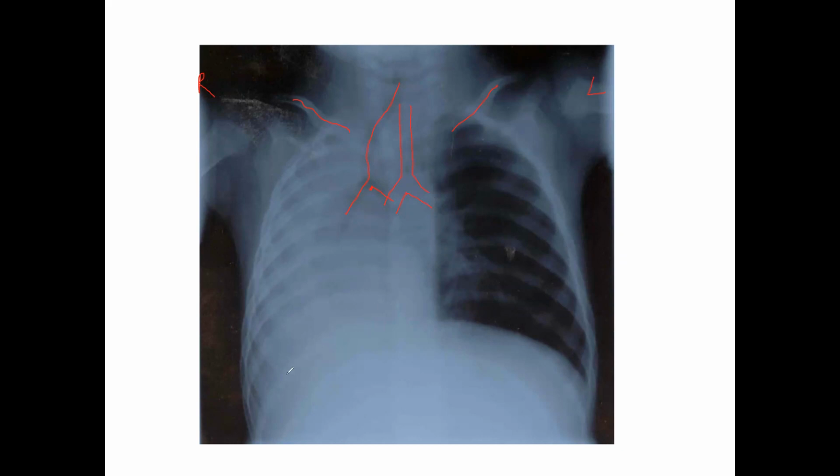Be able to pick out where your diaphragm is. So if we're looking at the diaphragm, I'm going to trace it. It's a nice dome-shaped muscle that shows up. And make sure when you're looking at your x-ray, you can see the entire chest on the x-ray. You also notice that this diaphragm here, and I'll finish drawing where, and I'm a little off because you can see some of it above here, but nonetheless, it comes to the rib cage.